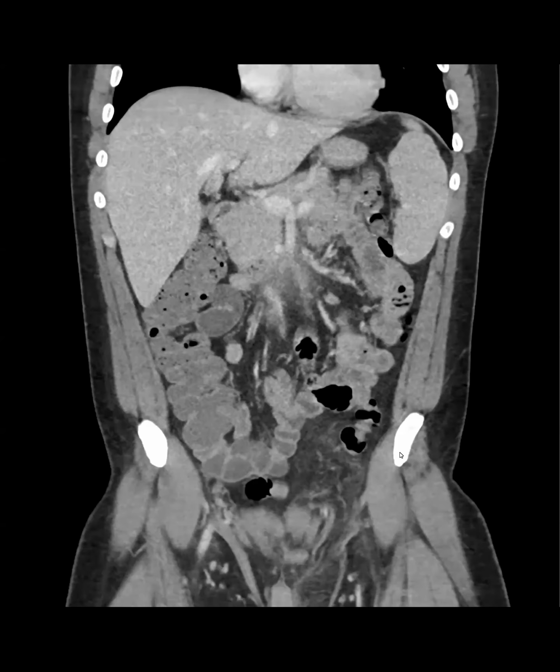Let me pull up the arterial. There's a pretty robust collateral right here that reconstitutes the ileal branches distally downstream, right there. Nelly, doesn't that have a name? Rising off the jejunal. I forgot the name. Is it the arc of Riolan, or something about that anastomosis? I don't remember.